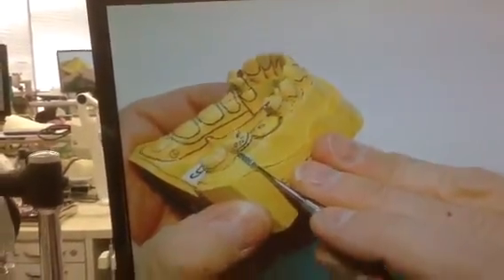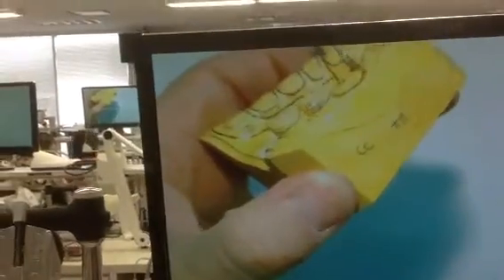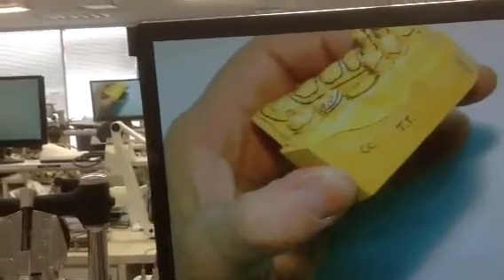So my instrument is, it's really hard to see, but the red pencil line is, so right there you can see the red, undercut is on the bottom edge of the clasp.